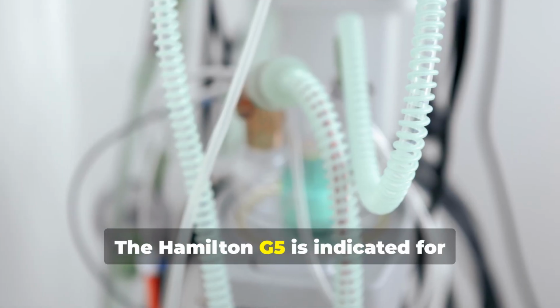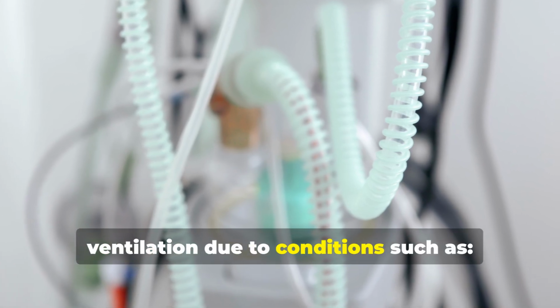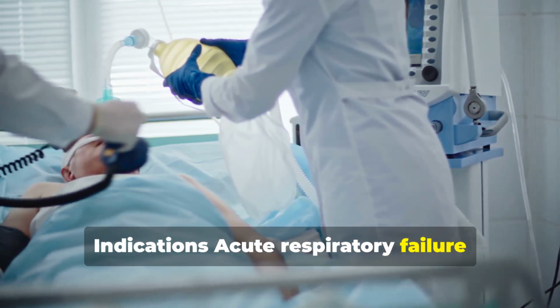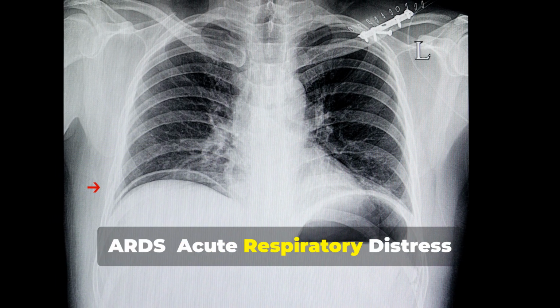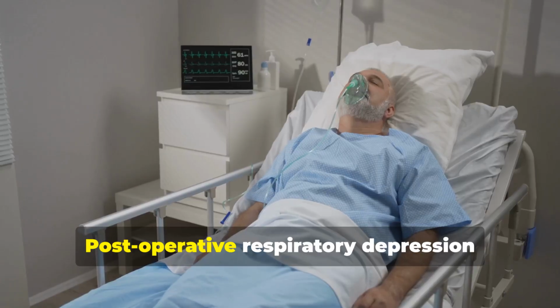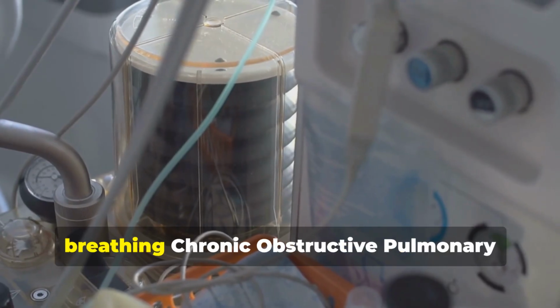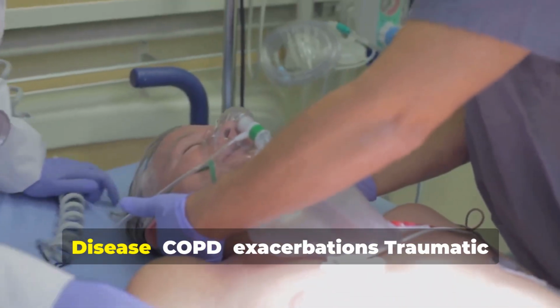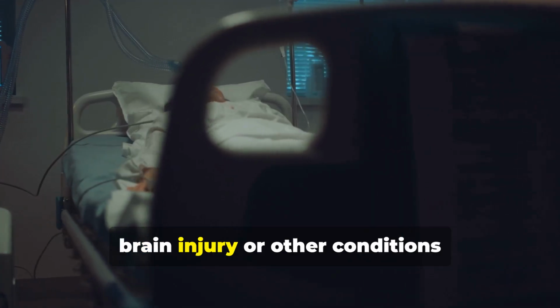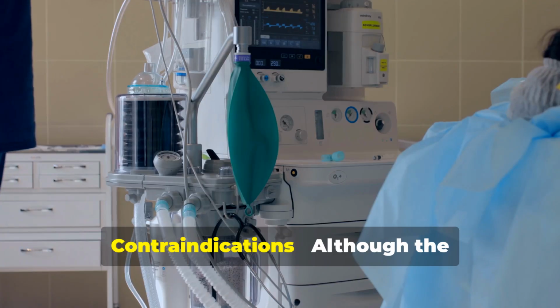The Hamilton G5 is indicated for patients who require mechanical ventilation due to conditions such as acute respiratory failure, ARDS, acute respiratory distress syndrome, severe pneumonia, post-operative respiratory depression, neuromuscular diseases that impair breathing, chronic obstructive pulmonary disease, COPD, exacerbations, traumatic brain injury, or other conditions requiring controlled ventilation. Contraindications.